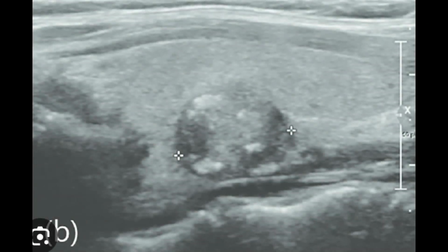Another classical example of peripheral disrupted calcification. Look at the thyroid, it appears to be hyperechoic. However, as far as the nodule is concerned, it happens to be slightly hypoechoic as compared to the echogenicity of the thyroid lobe. And the third important feature is peripheral disrupted calcification, which makes it suspicious, and it is a classical U4 nodule, and it would be termed as suspicious. So write down U4 nodule.